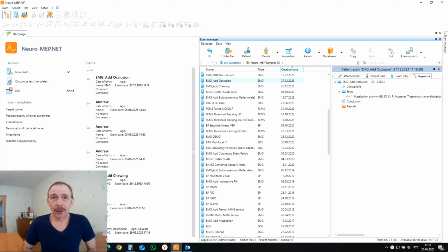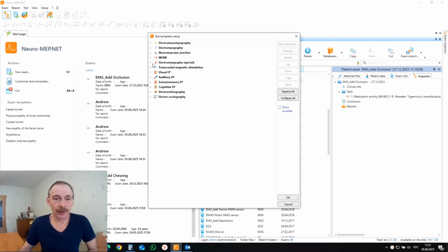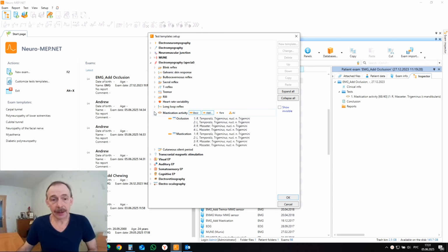Today I will talk about the recent changes in dental techniques in the NeuroMEP.net software. In the past, the program for assessing mastication activity had only one template in which both occlusion and chewing could be recorded. Now we have separated these techniques and now we have two different sample templates. If we look here in the mastication activity test, we can see the template for occlusion separately and for chewing separately, which is done for convenience.